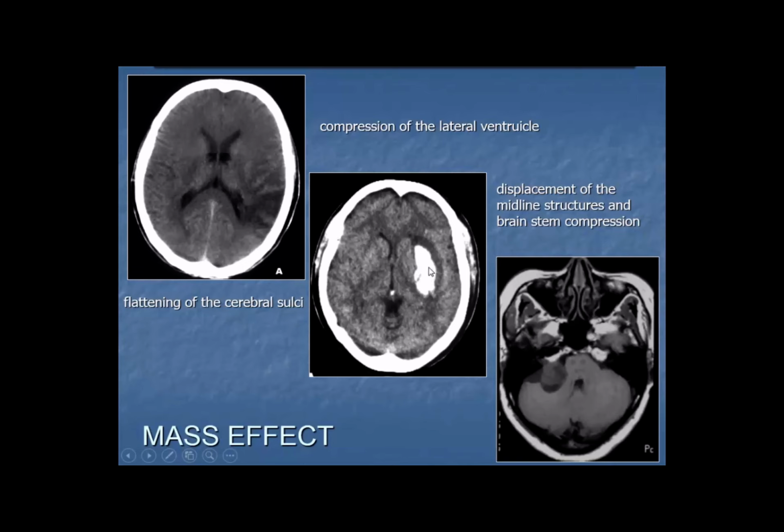This patient suffered from an intracranial hematoma with a slight mass effect. We can find compression of the lateral ventricle. This is a normal lateral ventricle. This left lateral ventricle is compressed.